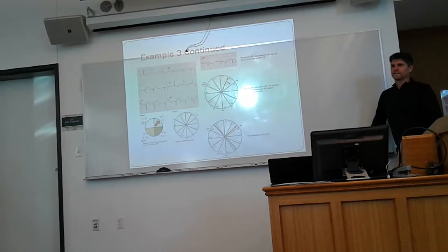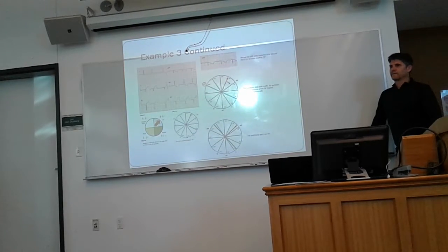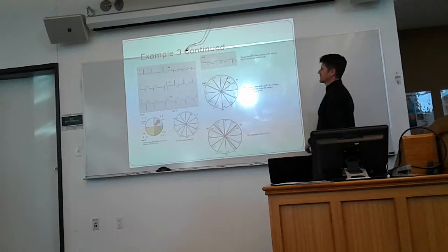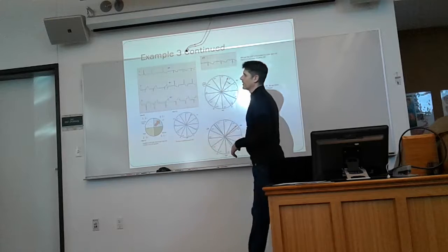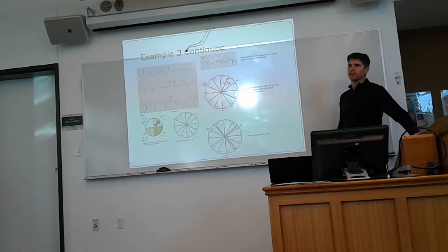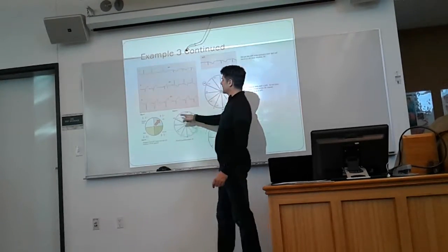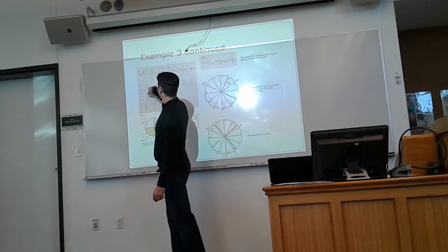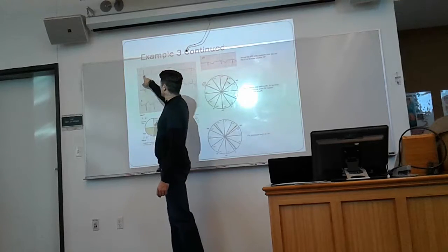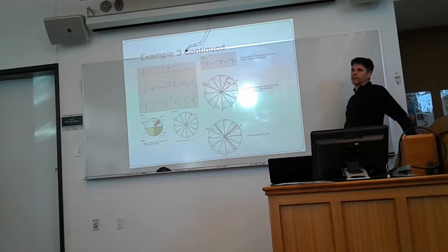Why isn't there downward deviation in lead one then? Well, there is a little bit, but we've got depression that's happening there as well, so that repolarization is going to muck it up a little bit too. Because there's something wrong with this patient. You've got clear ST elevation going on down here. You've got flipped T waves and ST depression going on here. You've got a little bit of elevation there. You've got some reciprocal change there. If this was a normal patient though, you would see a little bit of deflection there that you just can't see because everything is being disrupted already.